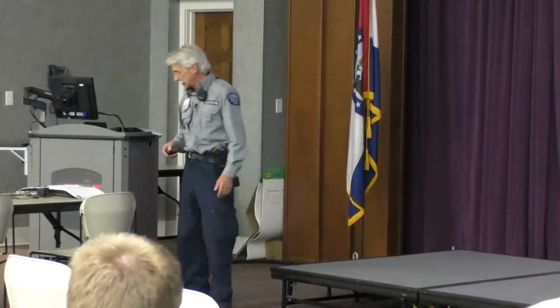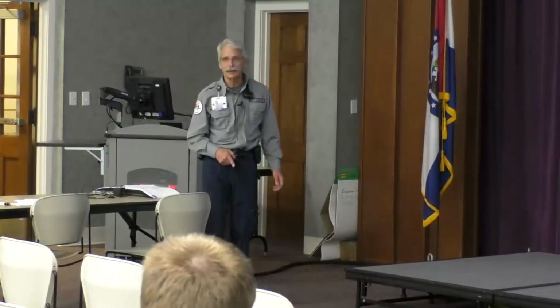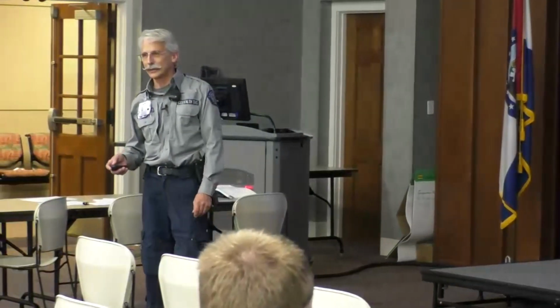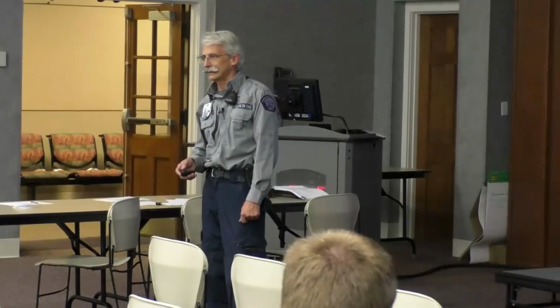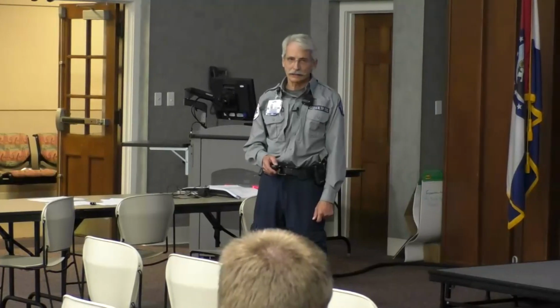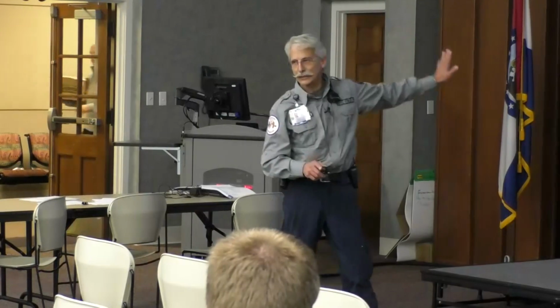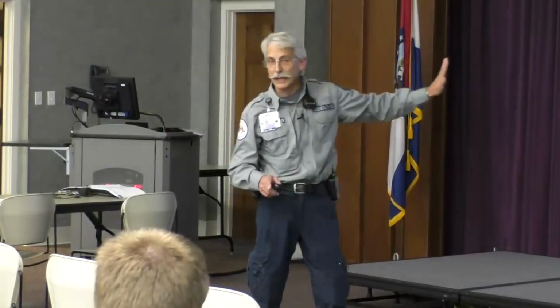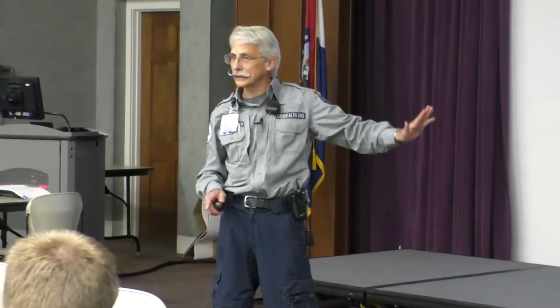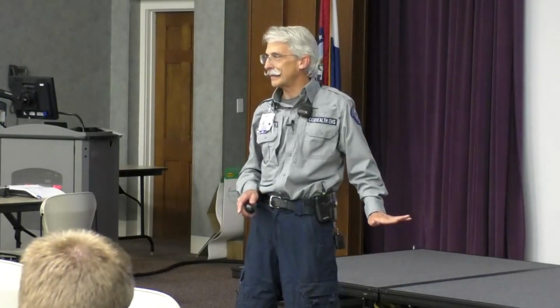So in this case, they do not meet the Sgarbossa criteria. I can talk about Sgarbossa some other time. We're just going to say it does not meet the Sgarbossa criteria. And because of that, we're not going to call it a STEMI based on the EKG. They may still be having an MI. The other thing I don't know is if this is a new left bundle branch block, then the MI may be causing it.